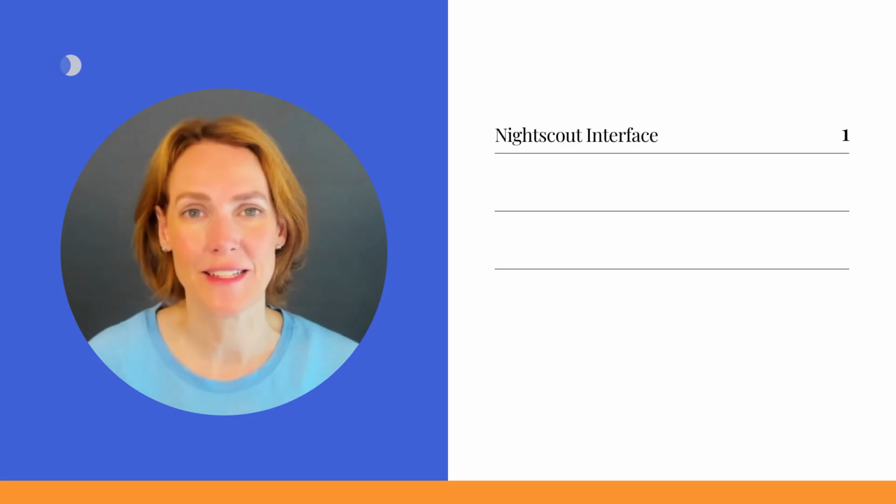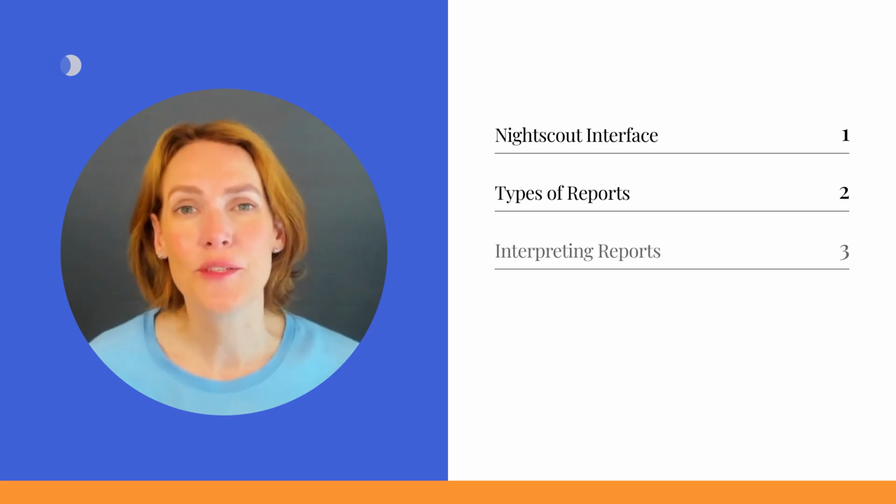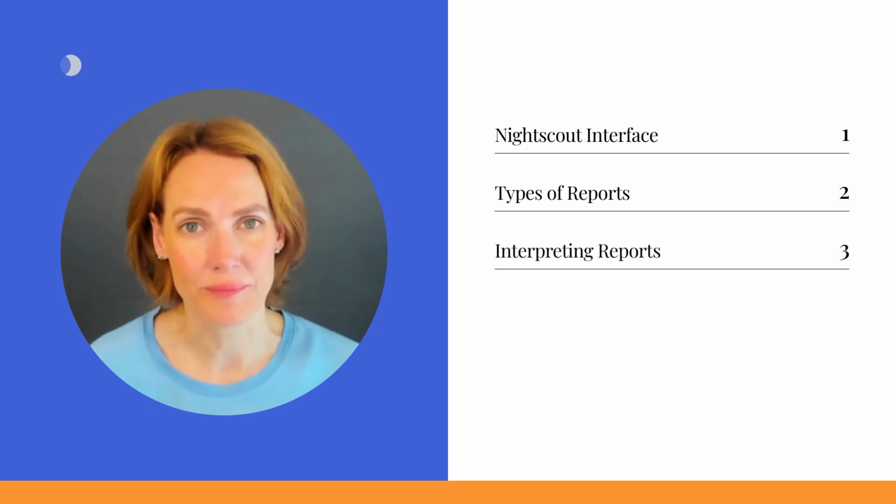In this video, we will cover the following topics: what information you can find on Nightscout, the various reports available in Nightscout, and how to interpret these reports effectively. By the end of this video, you will have a comprehensive understanding of how to access and utilize the reports in Nightscout, empowering you to make informed decisions about your diabetes management.